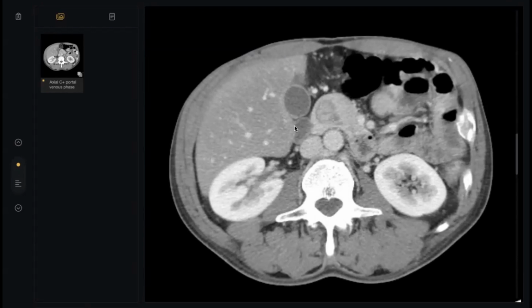I would like to see the coronal images to see any retrograde gut dilatation in this case, or any free air or anything else, which is an emergency. Excellent, doctor. Excellent. Let's go on. Thank you, sir. Go on. Do you have anything to say?